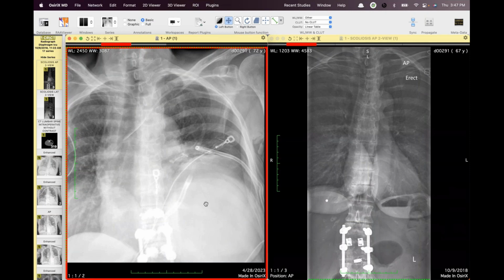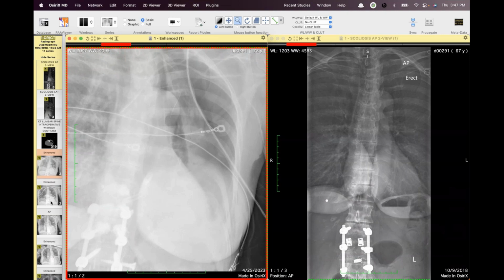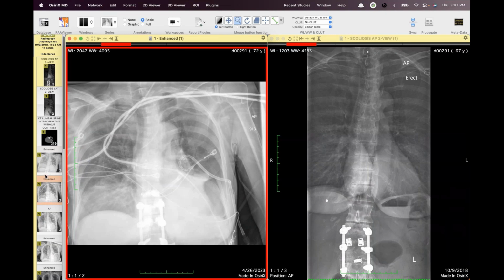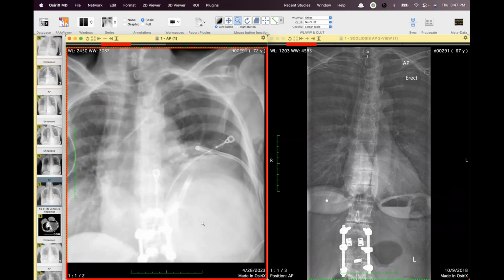Yeah, I was thinking, because this is the immediate post-op radiograph. They had a pneumothorax. You can see most of the lung is collapsed. They ended up putting in a pigtail catheter. So I was thinking this had to be some sort of a pleural collection or subpleural collection that was just increasing. And especially their diaphragm wasn't elevated prior to the surgery.